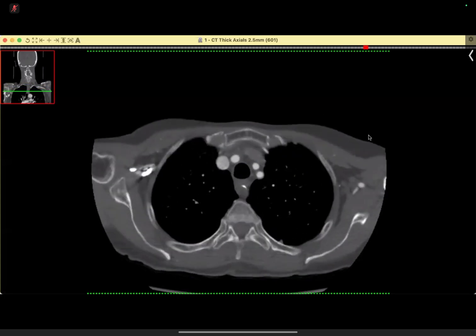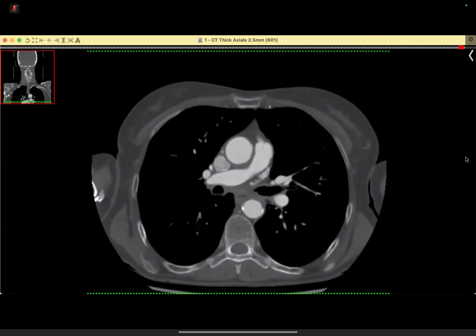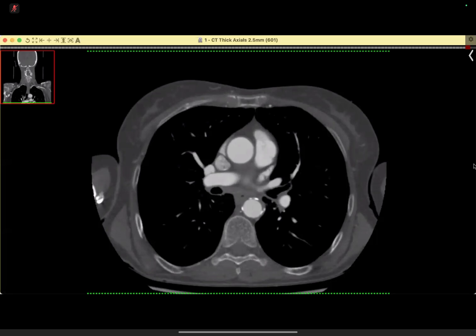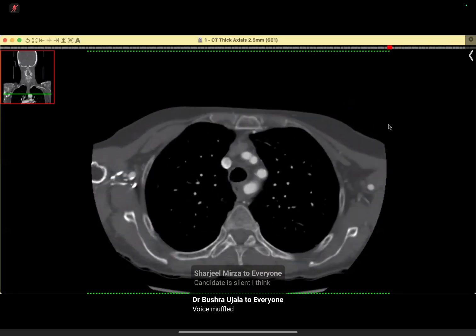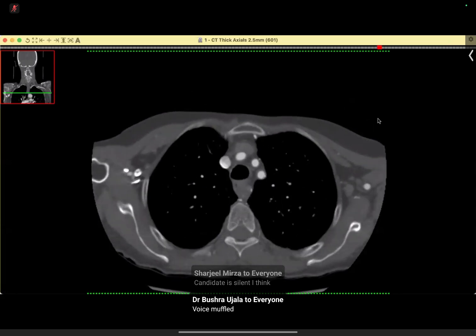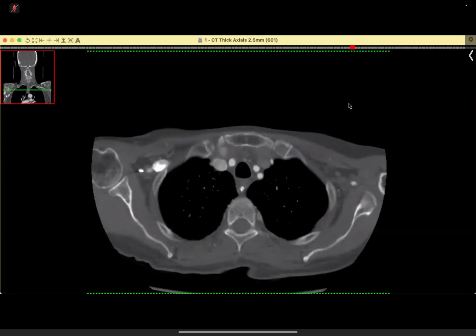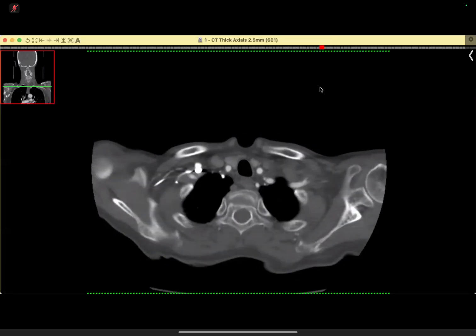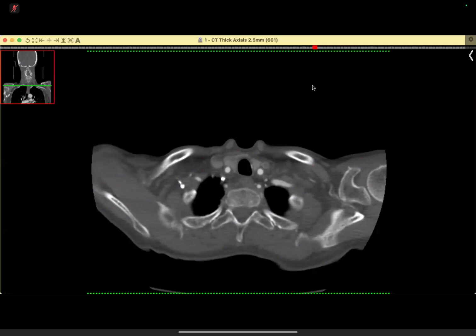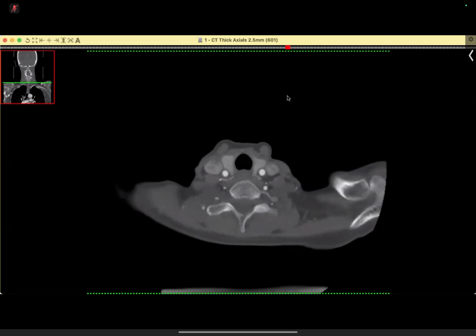Coming back to the next sections again. There are atherosclerotic changes involving the arch of aorta, and also looking through the origin again, the common carotid artery. Common carotid arteries show normal opacification and caliber on both sides. I'm looking through the proximal cervical portion.